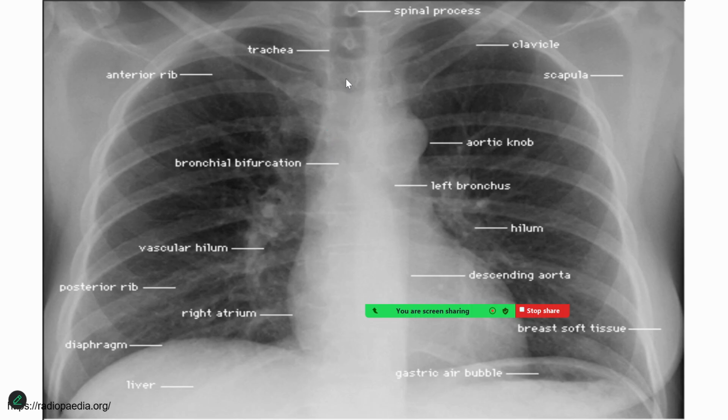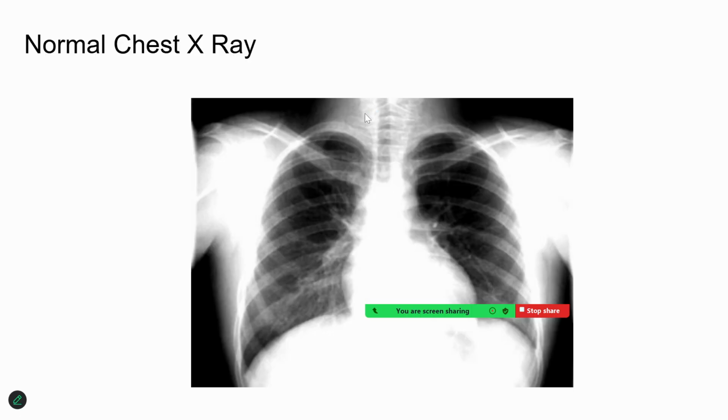Trachea can be seen to a certain extent as a lining containing the air. The air would be seen as a black color in a plain X-ray, and this can be seen. So that's how we may identify the normal structures to read when an X-ray image is given.